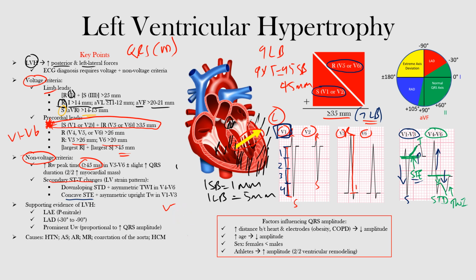Again, we have a lot here, so let's just erase this. So we can look at lead 2, and we can look at lead V1, okay? And this is P mitrale, a sign of left atrial enlargement. In lead 2, remember, we can see those M-shaped P waves, okay? So this is a P wave. The duration will be greater than 110 milliseconds, okay?